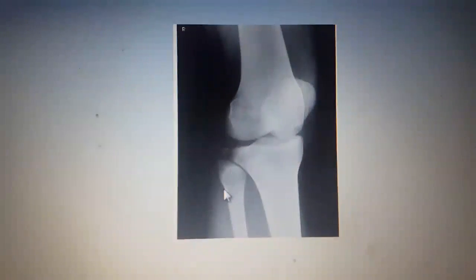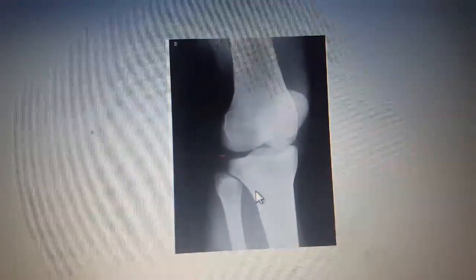For the second projection, which is the AP oblique knee with medial rotation, we first want to check as well for evidence of proper collimation in the image. Also, the tibia and fibula separated at their proximal articulation. So we could see here we have our fibula and tibia and they're separated. As well as the lateral condyles of the femur and tibia.